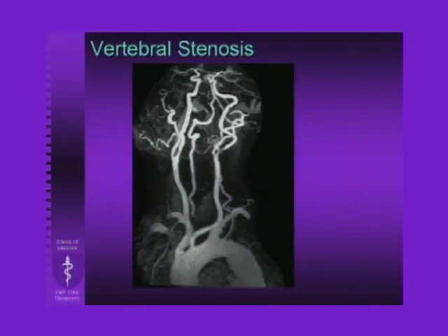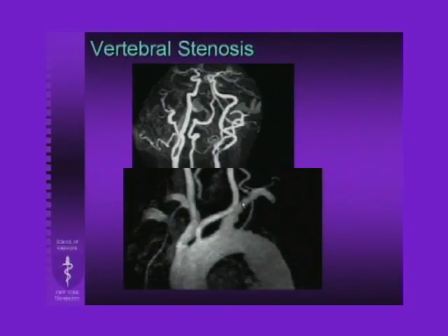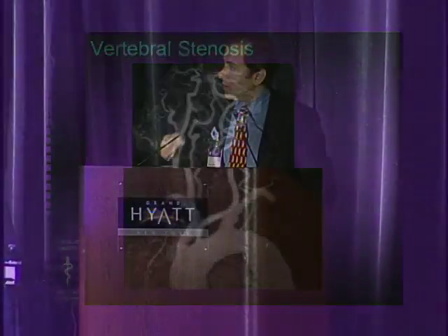So with the non-contrast study, we of course couldn't really examine that. Now with the contrast study, we can, and you can see here there's a tight stenosis at the origin of this right vertebral, and there's a moderate stenosis, I can blow this up actually, at the origin of the left vertebral. So this is someone with bilateral vertebral stenosis. That's a bad thing. If you have only one that's out, you can probably do okay, but to have bilateral stenosis is a problem. So this is really important, and I would encourage you, as you do these contrast studies, really spend the time, again, look at the source images if you need to, but find the vertebrals and document what's going on with them as well.